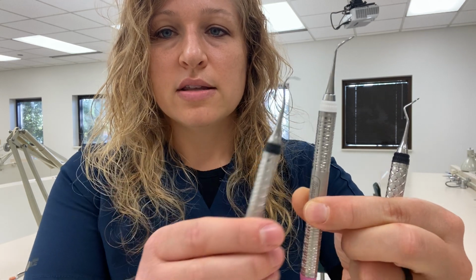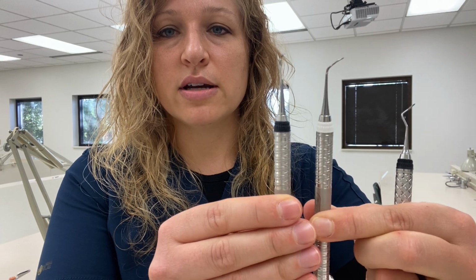It's got this point on the end. The difference between these two, what do you think, anterior or posterior? This one's going to be posterior because it's got more curves. Then you're going to have a 204S. This is one I feel like is very common in offices, so you're going to see this one a decent amount. We like for you to get used to it because of offices.